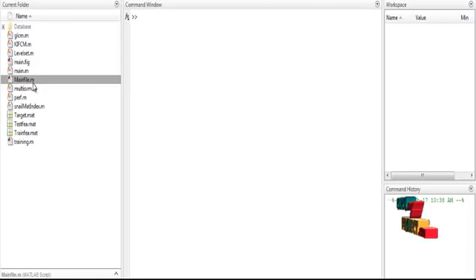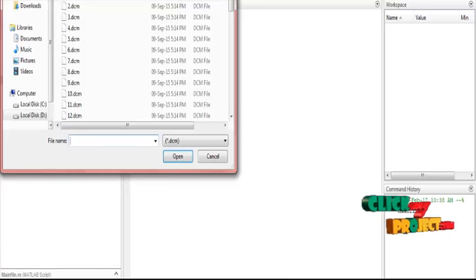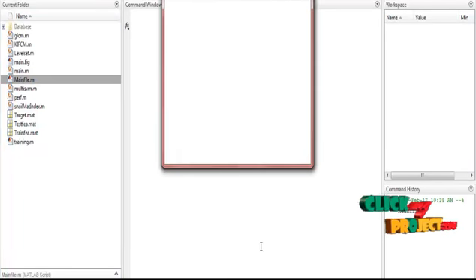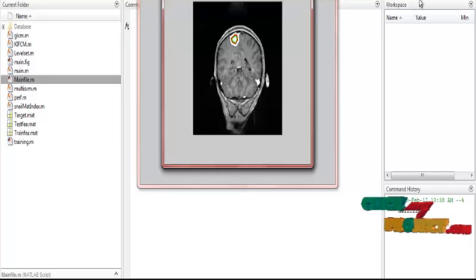Let us discuss the running procedure for the project. Click the main file and then run. In this window we take the input image of the brain. First select the input image and it will open. Similarly for all the images, the output results are displayed.